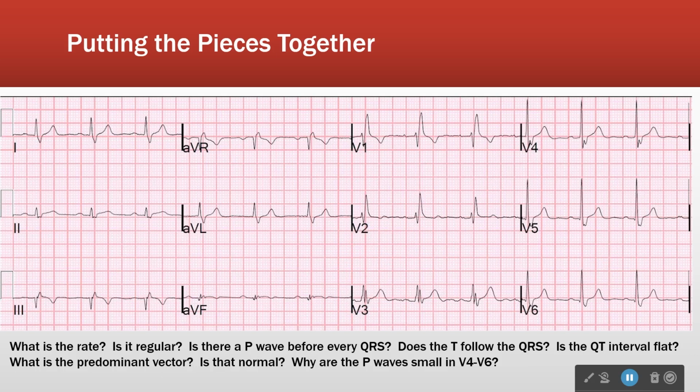Now the fun part is what's the vector? Anybody practice over the weekend on the vector? Or you just had your heads in anatomy? Anybody remember the super easy way to do the vector? So what's the vector on this one? The thumb one? Somebody want to walk us through it?